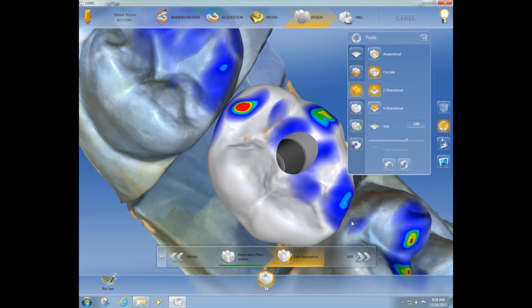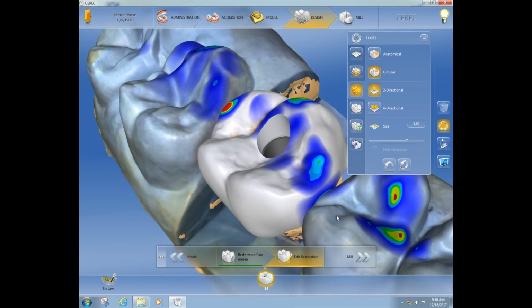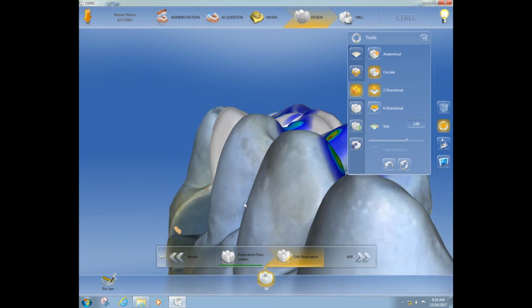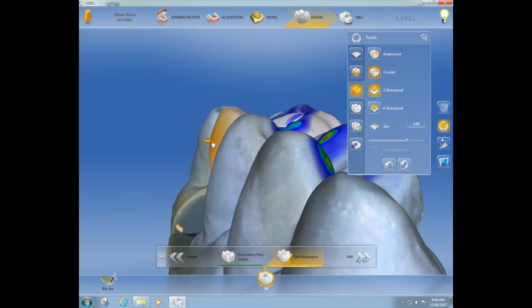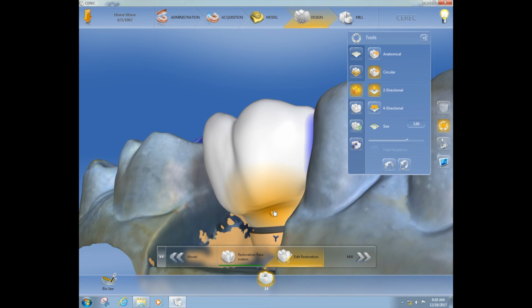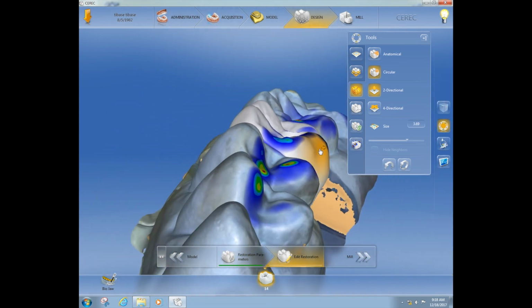Right now I'm only doing big muscle movements, like just kind of closing the contacts. I'm ignoring the occlusal contacts right now, just kind of getting it all lined up. Looking down the buccal corridor just to see if this looks okay. Is that too bulky or is it not enough? Since it was placed a little bit poorly, we'll have a little bit of extra space here. I'm going to go in later and smooth this, but for now, I'm just showing you getting it into the arch form and making it look pretty good.